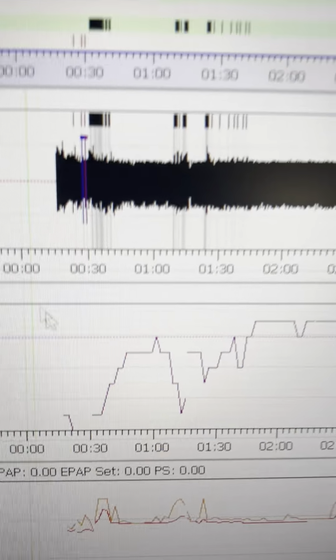So if you up the CO2 and see these kinds of breaths going away, just look at this here. So this is night 1, where I have 75 cc. That means just the mask and tubing where my CO2 gets saved up, basically. I add 50 cc more right here. And suddenly all of these timed breaths go way less. And I don't know if you can see on this graph right here, it's a lot more big and up, and here it's getting a bit smaller.